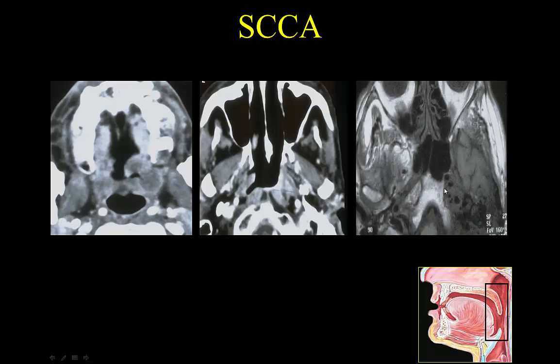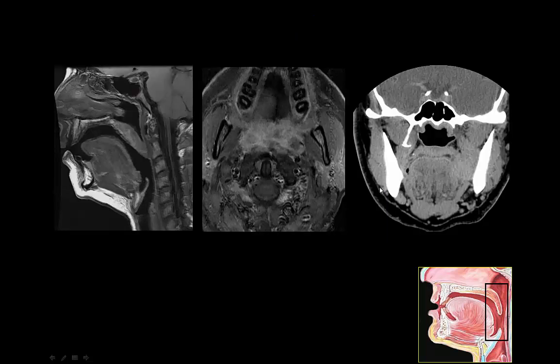And when we look at the skull base, this tumor is growing superiorly into the nasopharynx, and here we can see replacement of the normal marrow that should be in the petrous apex by this tumor. So this indeed was superior spread of a squamous cell carcinoma. All of this was submucosal. It could not be seen clinically. As a result, when they looked at the imaging studies, this patient was deemed unresectable.